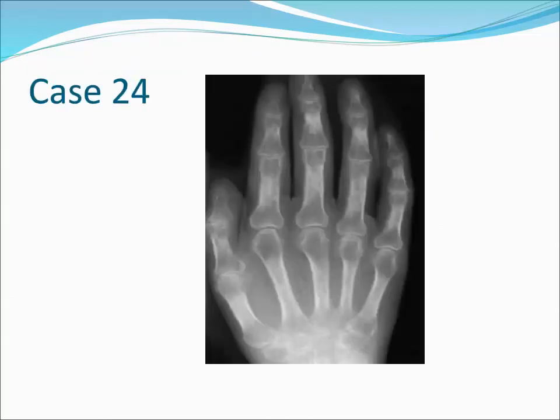Case number 24, there is patchy demineralization most severe near the joints, which is quite characteristic. Rapid development of often patchy osteoporosis associated with painful soft tissue swelling following trivial trauma. Cerebrovascular disorders, cervical spondylosis, discal herniation, post-infectious states, calcific tendinitis, vasculitis, and neoplasm are other implicated conditions. Probably of neurovascular origin. Findings of reflex sympathetic dystrophy.